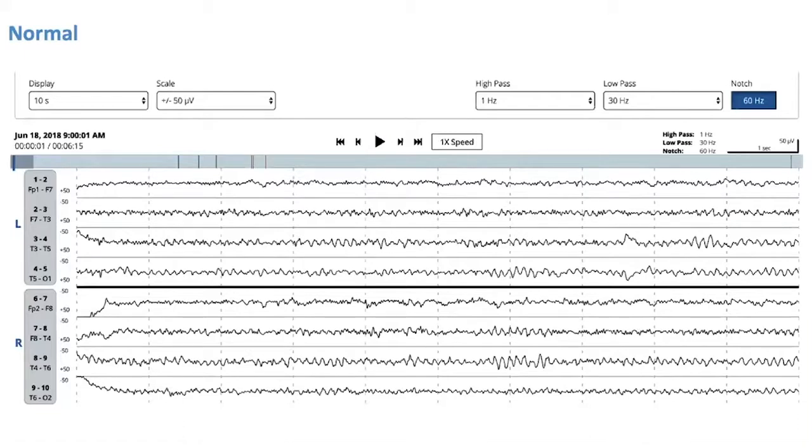And so I think when looking at EEG, one way to go about this is to first make sure you're not seeing noise, and then if you're not, look for patterns that are more likely to be epileptiform, with the idea that if it's not that, it might just be normal. And so it's easier to go in that direction than the other.